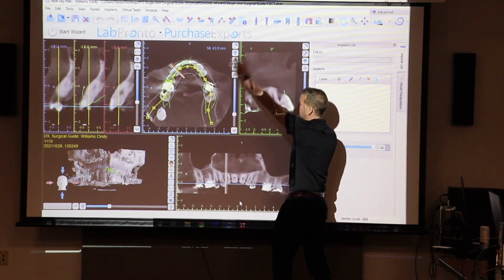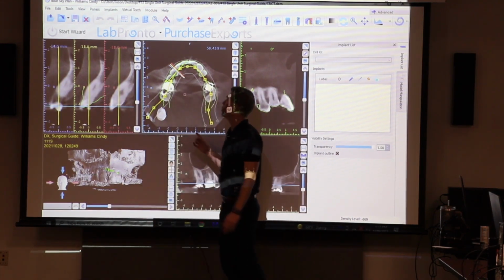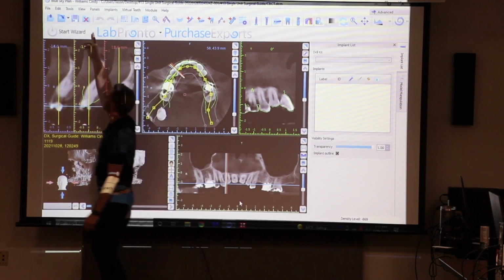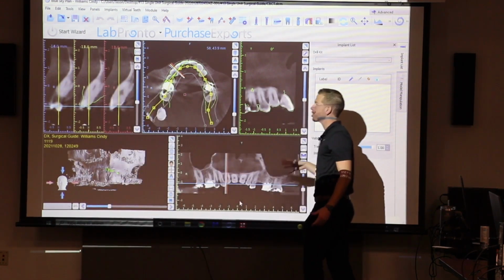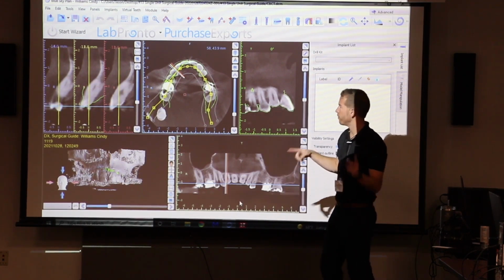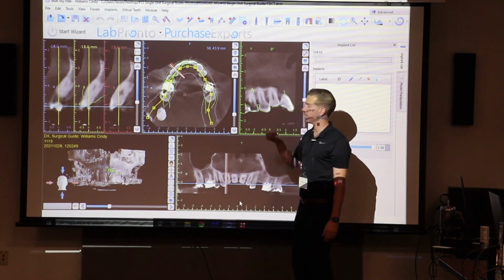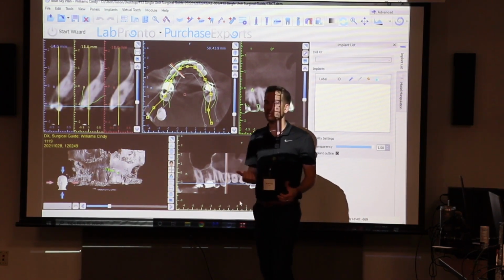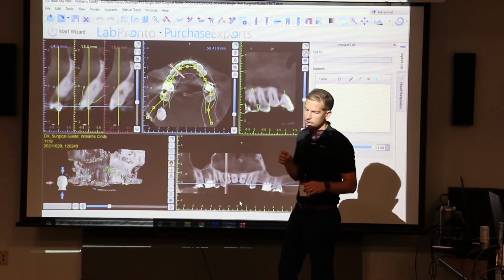We talked about all this. The black is called the view. And the view, there's a few different ways to view it. If you see this little toolbar up here called view, you'll notice there's a bunch of different ways to view your screen. This is called the tangential 5, where you've got 5 different views of your scene. This is the one that I like to do. It takes some time to get used to because you've got 5 different views of different things.